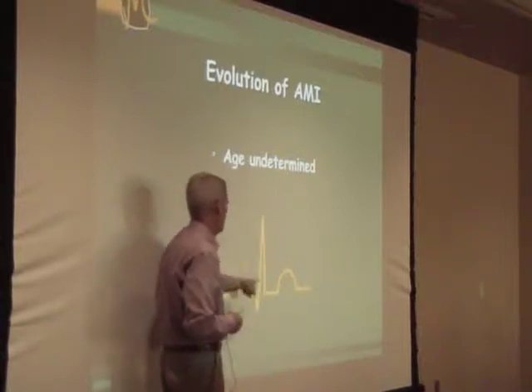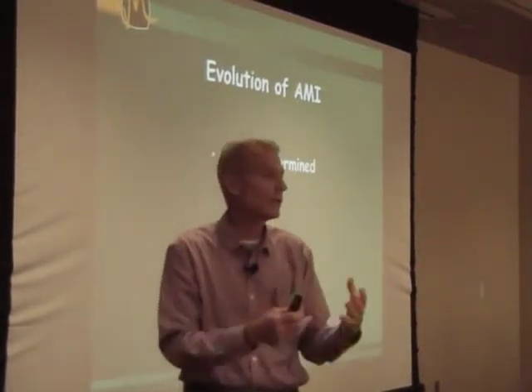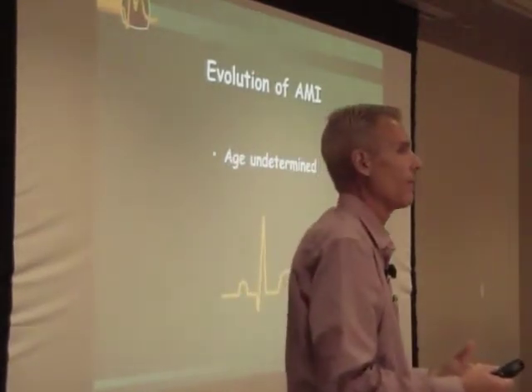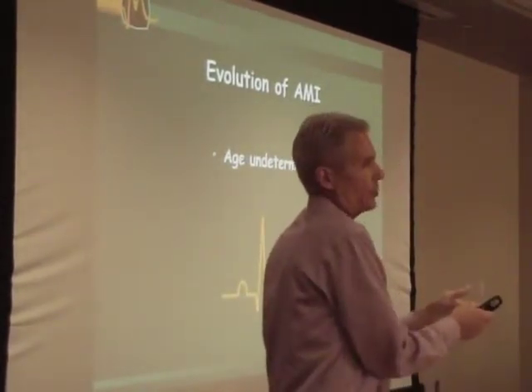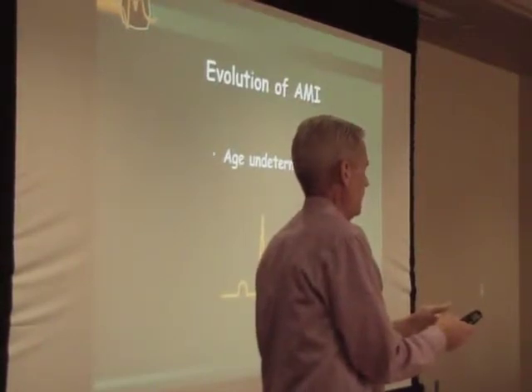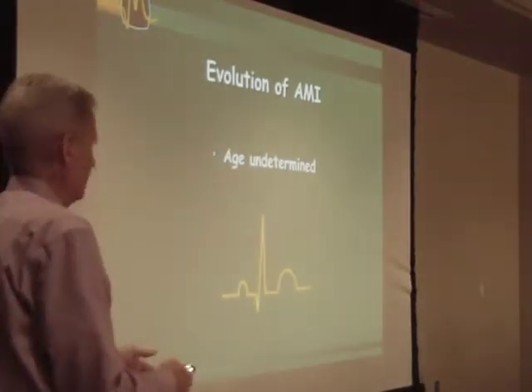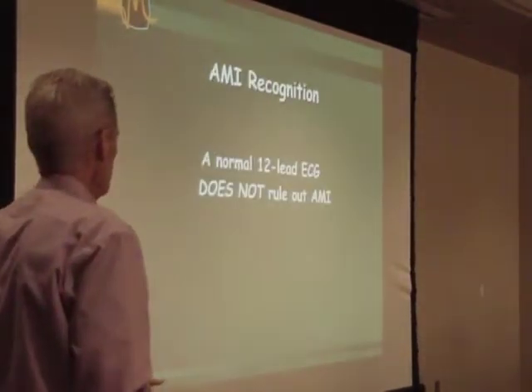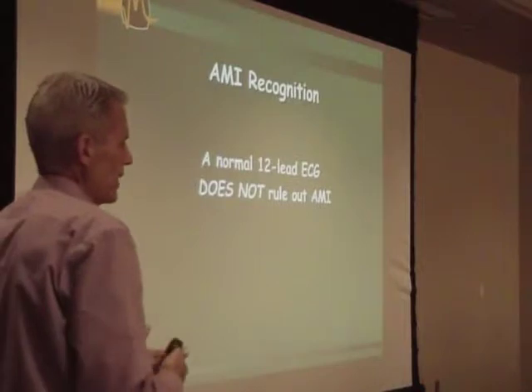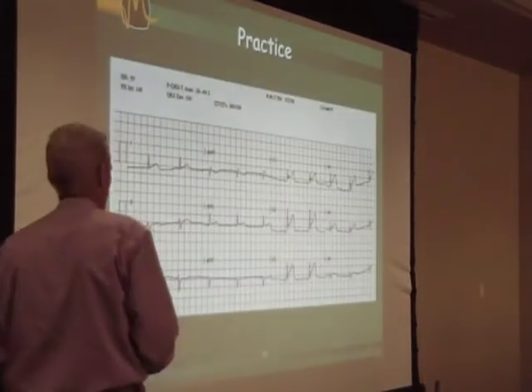Going to take note of this, but if I'm not seeing J or ST segment depression or elevation, and I'm not seeing changes in the T wave, I'm not so concerned at that point because there's no current event occurring. But it lends information to your patient's background. Again, a normal 12-lead does not rule out the fact that someone might be suffering an acute MI.